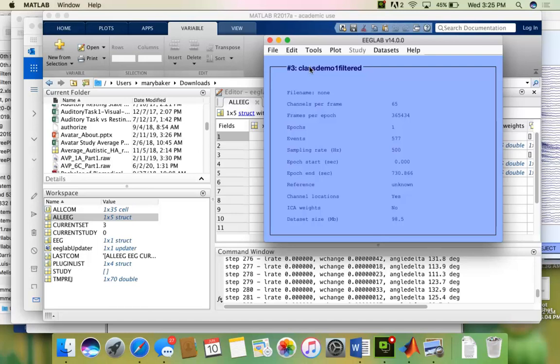So instead of 0.5 to 50, I just did a 0.5 on the high pass end, and then I did a 50 on the low pass end, and I just ran it through 2 separate filters. That seemed to resolve that situation. Hopefully that'll work for you. I think it has to do with the version of MATLAB you're using, the operating system, and the version of EEGLAB you're using. I do know they improved the filter tool with later editions of EEGLAB. I just don't know what else they changed.